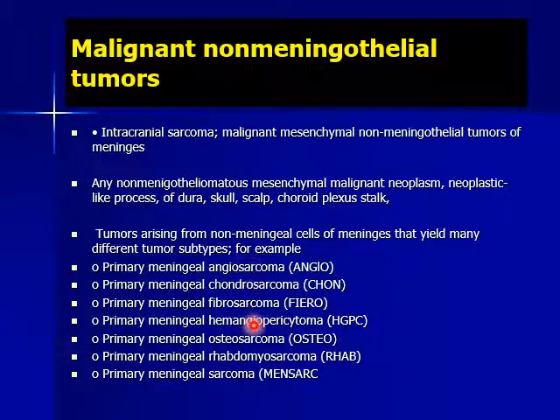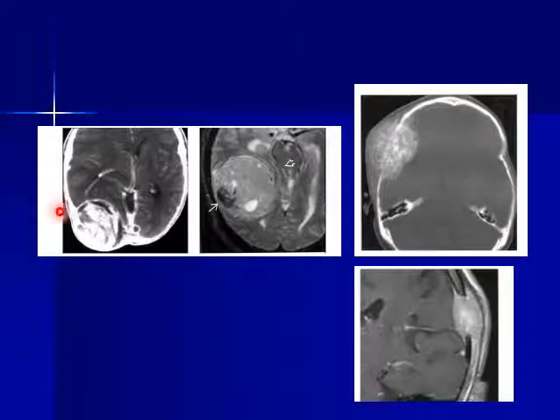All of these are very aggressive, and sometimes you cannot differentiate. Okay, but if you see characteristic features of new bone formation, such as in osteosarcoma, you can tell that it's osteosarcoma. Let us see. Okay, these are aggressive mesenchymal tumors. Actually, you cannot differentiate them from malignant or atypical meningioma, and in this condition you should put in mind in your report that it could be an aggressive mesenchymal tumor.